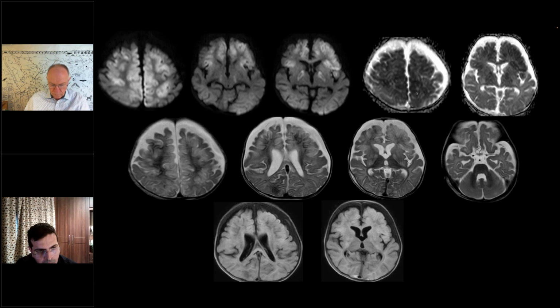Because for a hypoxic insult, the involvement of the globus pallidus and sparing of the putamen and thalamus is slightly unusual given the extensive involvement of the frontal and parietal cortex and subcortical white matter. The hypoxic insult, again, I had said that before, but I have observed this in this age group. The globus is affected in hypoxic insult along with the watershed zone. This globus involvement is suggestive of a hypoxic insult.